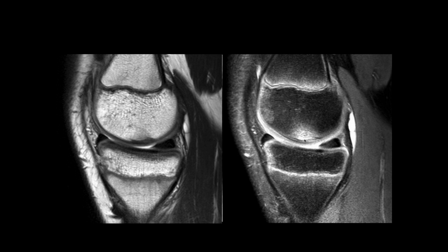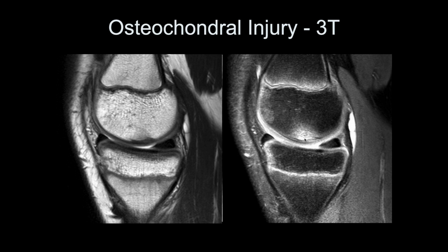And here we can see the same thing on the sagittal images. So this was an osteochondral injury. John, what was your comment?